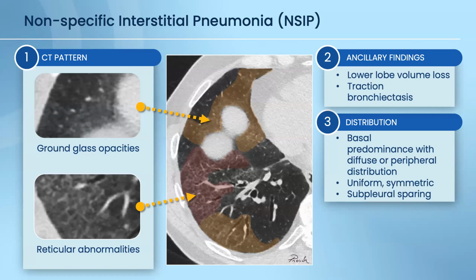Okay, then there are other questions coming in here. Dilated pulmonary vessels. Yes, there are. We notice also from other studies that the pulmonary vessels get enlarged, but this is hard to judge on just a visual basis. It's easier to determine an enlargement of bronchi than the enlargement of vessels. We have special software to determine also the enlargement of vessels, but on a visual basis, that's very subjective. That's why we don't include this in our differential diagnosis in the pathway.